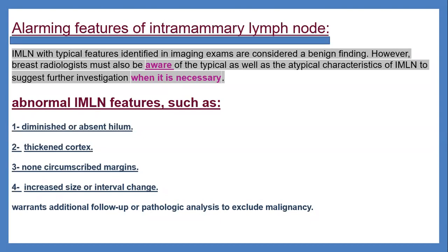Increase in size on interval, or a change in characteristics on interval. This warrants additional follow-up or pathological analysis to exclude malignancy.